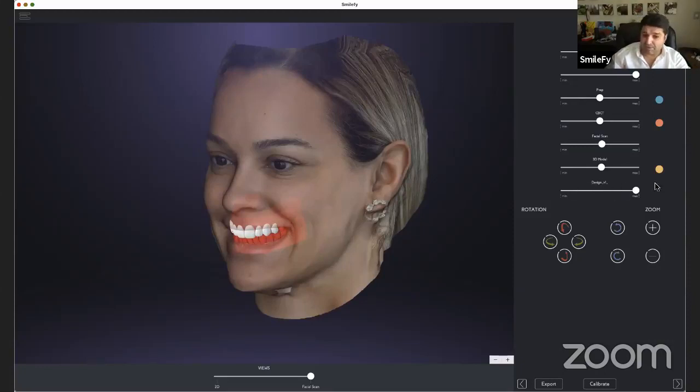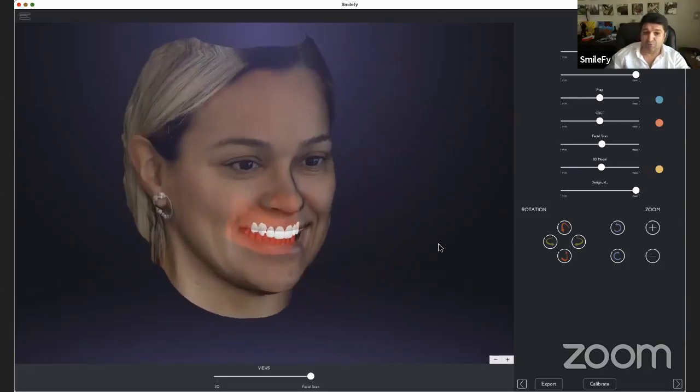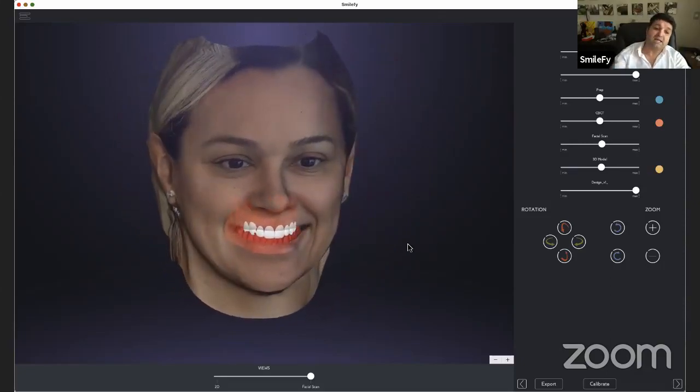And in the digital patient, you have an additional layer of 3D objects with design number 2. So you can just compare the design versions with one click. That's also powerful because then you can decide which model, for example, to print.